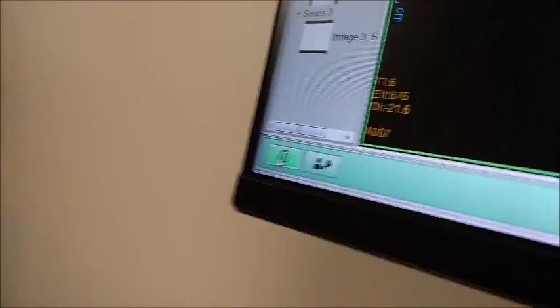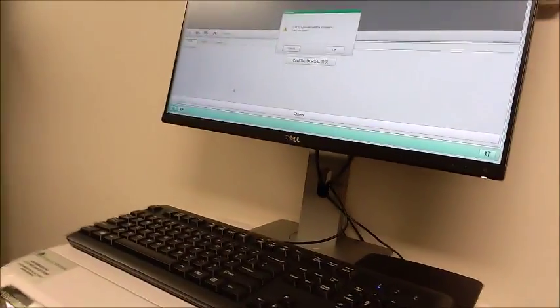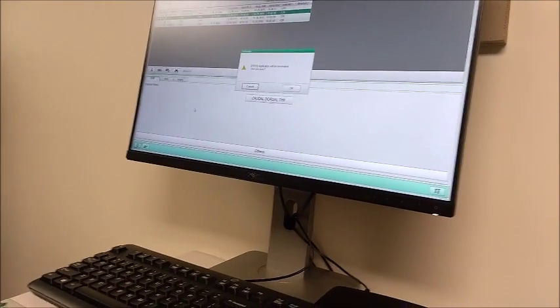Okay, that's simple enough. Power button. So wherever you are, you can just shut it down, whatever you're still doing? Yeah, pretty much. Okay.